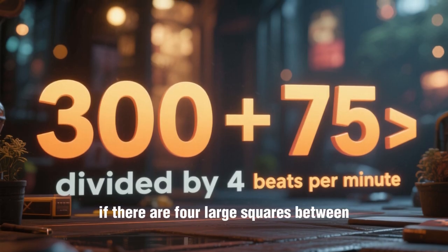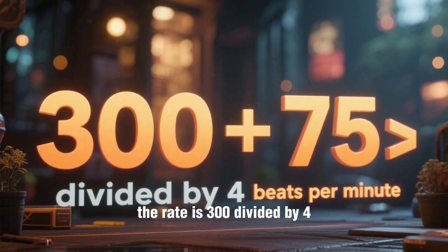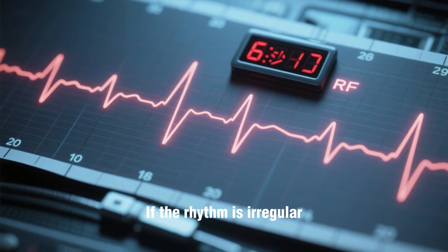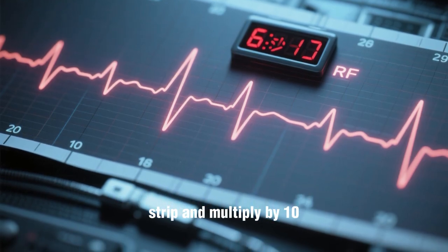So, if there are 4 large squares between R waves, the rate is 300 divided by 4, which is 75 beats per minute. If the rhythm is irregular, you'll need to count the number of R waves in a 6-second strip and multiply by 10.